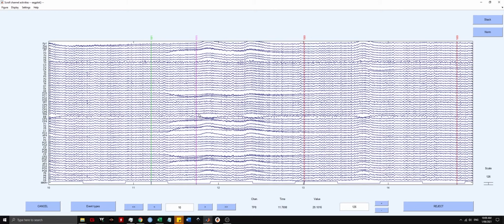experiment. In this sample data, participants did an experiment where they were presented with odd and even numbers, and they were only required to respond if they heard an odd number by pressing a button, but not to do anything if they heard an even number. So even numbers are represented by 100, odd numbers by 101, and the response is marked by 111.